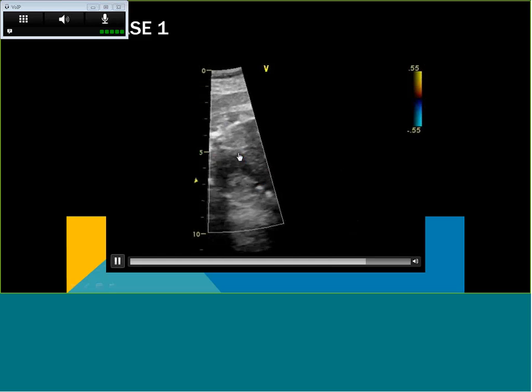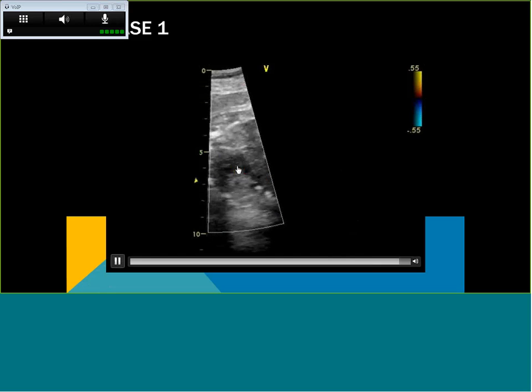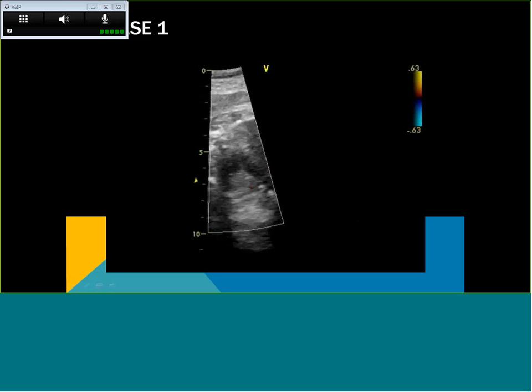And then here, again, same structures but with color Doppler, pulmonary trunk to ductus and transverse aortic arch. And here is an example of what I would call continuous anterograde diastolic flow, what we sometimes refer to as hang-up or drag. It's just a little bit abnormal flow there, but anterograde, so similar to that example that I showed you in those 4 3-vessel trachea view pictures.